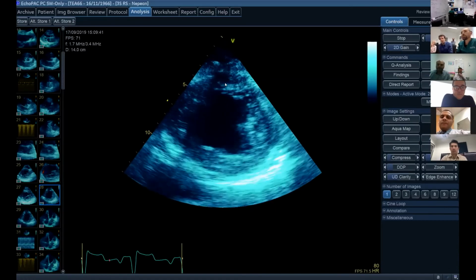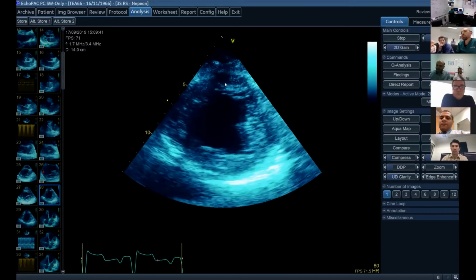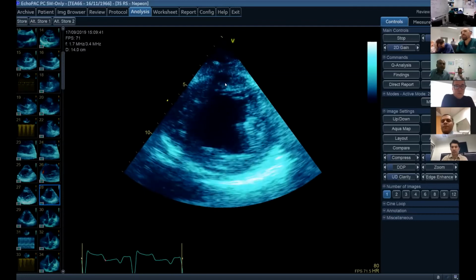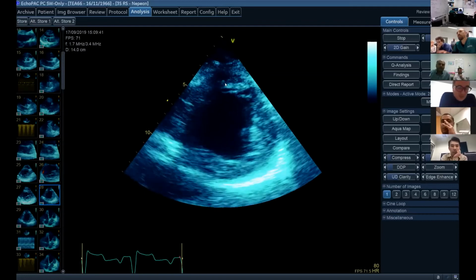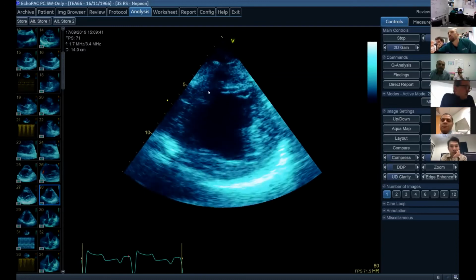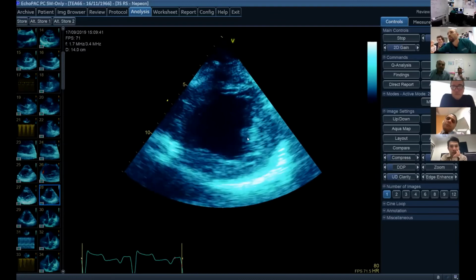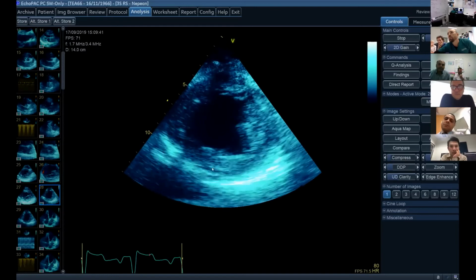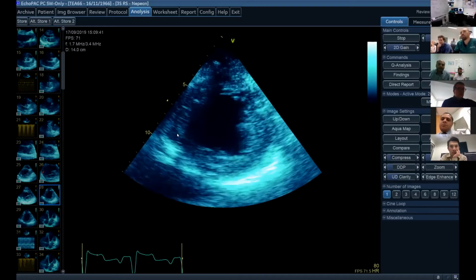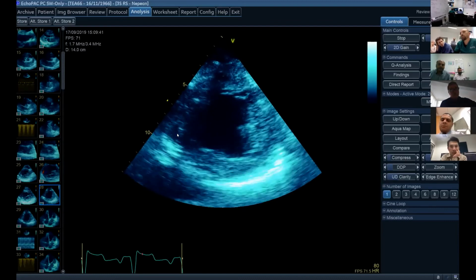Okay, coronary artery disease territory, what territory? So in the mid-papillary view, this is something that I need to constantly revise, but LAD is essentially this part, so anteroseptal. Lateral is LAD or circ. And then the posterior part, including the posterior part of the septum, is RCA. RCA, very nice. Okay, so what other rules do we have about regional wall motion abnormality?